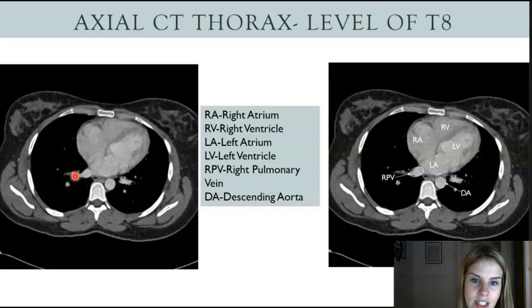So again, this is the sort of thing that I would want you to be able to label and identify, the 4 chambers. Again, there is other anatomy on there, vertebra, all that kind of thing, but just focus on the heart for this purpose.